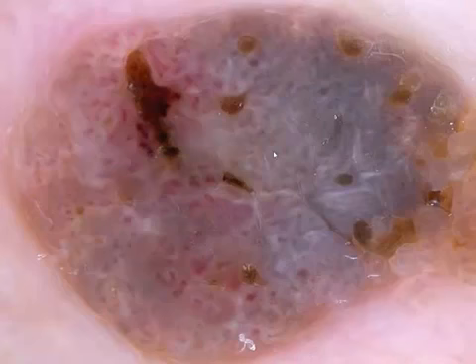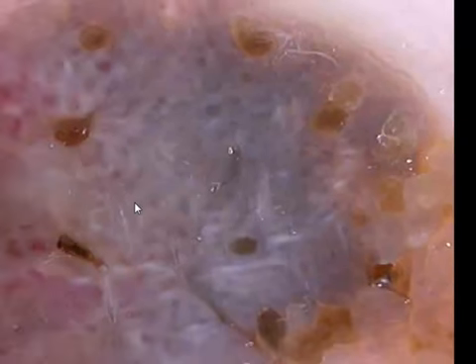This lesion is structureless, although it has some brown clots, but its main pattern is structureless, it's multicolored, and it also has white lines. But there are other clues that tell you that this is not a melanoma. And the clues here are comedo-like openings, but they do not appear as comedo-like openings, they appear as brown and orange clots. But the orange clots are a good clue to what? Of course, the seborrheic keratosis.